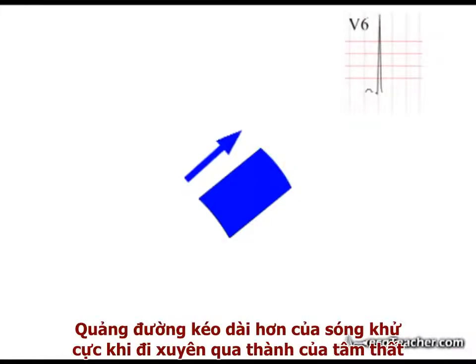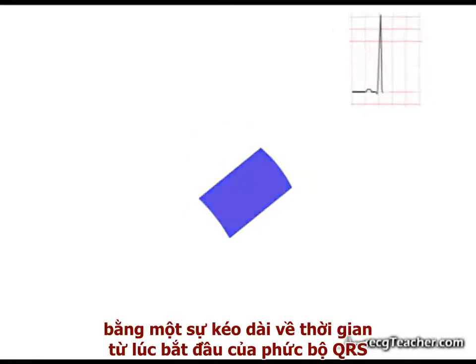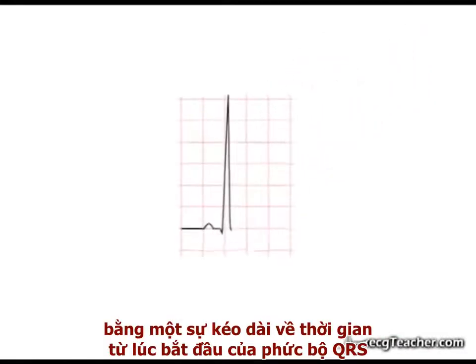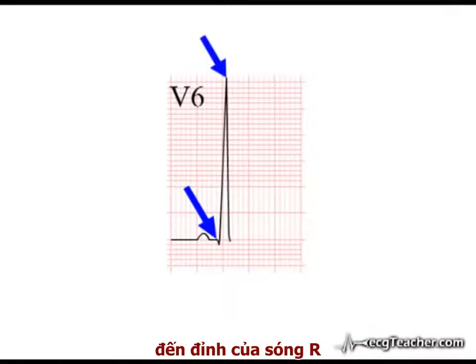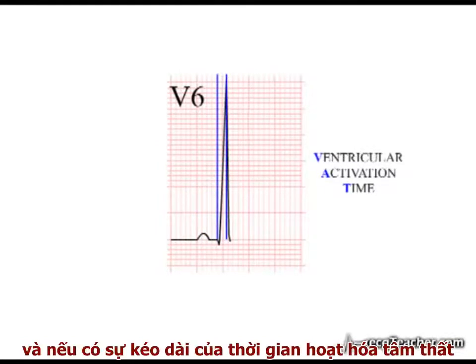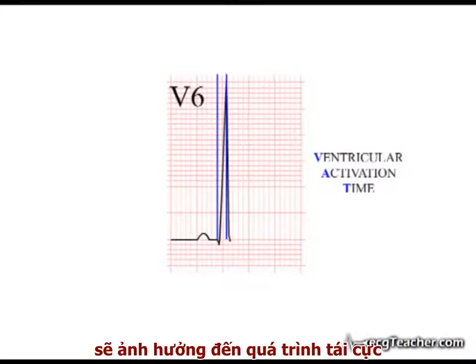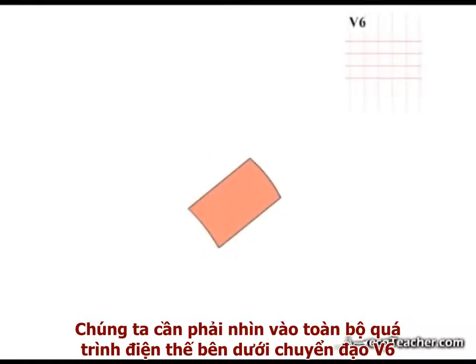Prolonged transit of the wave across the ventricular wall will manifest on the ECG readout as an increase in the time from the onset of the QRS complex to the peak of the R wave. This period is known as the ventricular activation time, and prolongation of the ventricular activation time impacts on repolarization. To understand how, we need to look at the complete sequence of electrical events under V6.